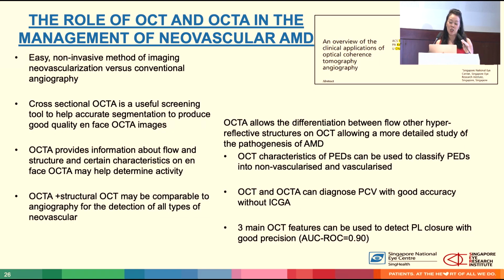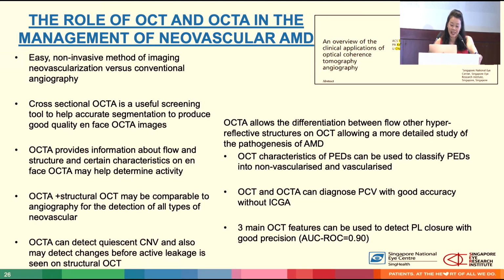And OCTA and structural OCT are now comparable to angiography to identify a lot of neovascular AMD. And quiescent CNVs can also be detected before active changes appear.